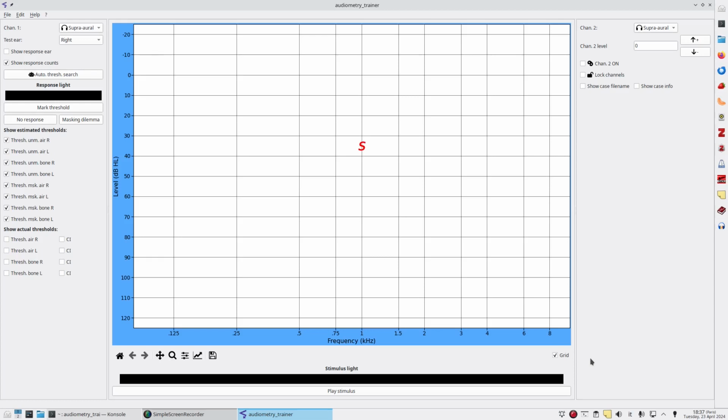And this allows you to measure the audiogram for these patients, and so you can practice clinical audiometry and also, when necessary, clinical masking. The simulations are done on the basis of psychometric functions, and this makes the software quite realistic in the sense that the detection of a stimulus at a given sound pressure level is not deterministic, but it is probabilistic, with the probability of detection of the stimulus increasing with increases in the stimulus level.